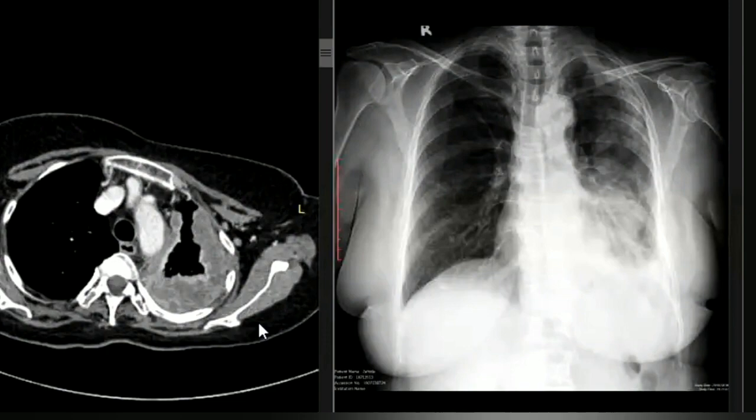If you are thinking that there is collapse and that it may be due to tuberculosis, then you should have been able to see the tuberculous fibrosis with cicatrization, collapse, and bronchiectasis.